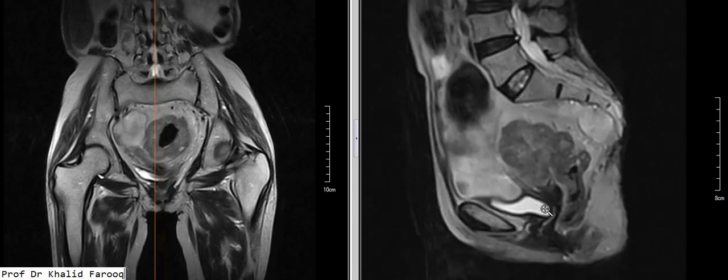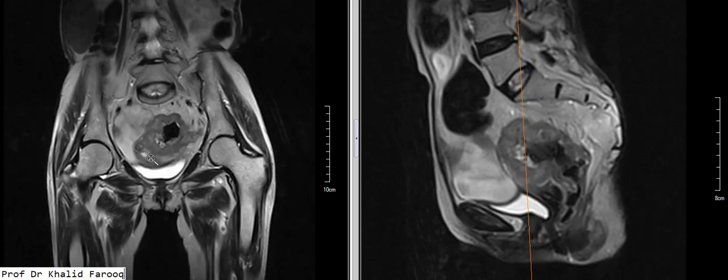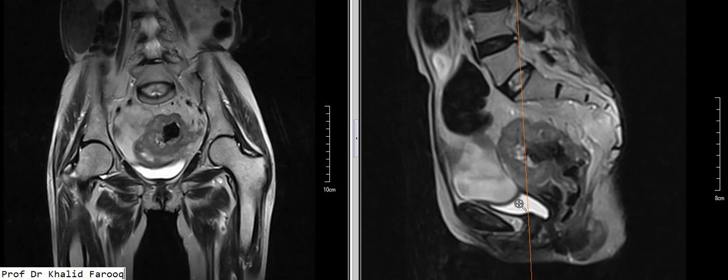Like in this patient, we see that the uterus is pressed anteriorly and there is indistinct interface along the posterior aspect of the uterus from the growth. This can also be confirmed on coronal images. This one is the uterus, which is displaced and compressed by the mass lesion, and intervening fat planes are lost. So this is very important, that we have to rule out involvement of adjacent viscera. Urinary bladder is unremarkable. It is smooth walled.